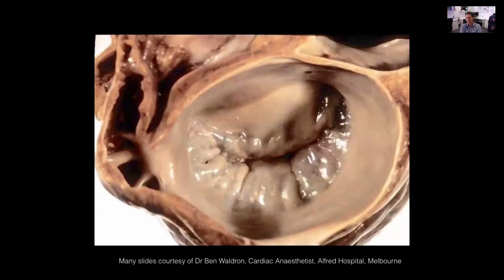So the mitral valve is a horseshoe-shaped structure, with the larger anterior leaflet much bigger than the posterior leaflet. There are 3 scallops on each side: A1, A2, and A3, and on the other side, P1, P2, and P3, with an anterior mitral commissure and a posterior mitral commissure. I know that this is the anterior one when I'm looking at it, because it's next to the left atrial appendage, and then you'd have the aortic valve up at the top, and the tricuspid valve next door to it on the posterior aspect.